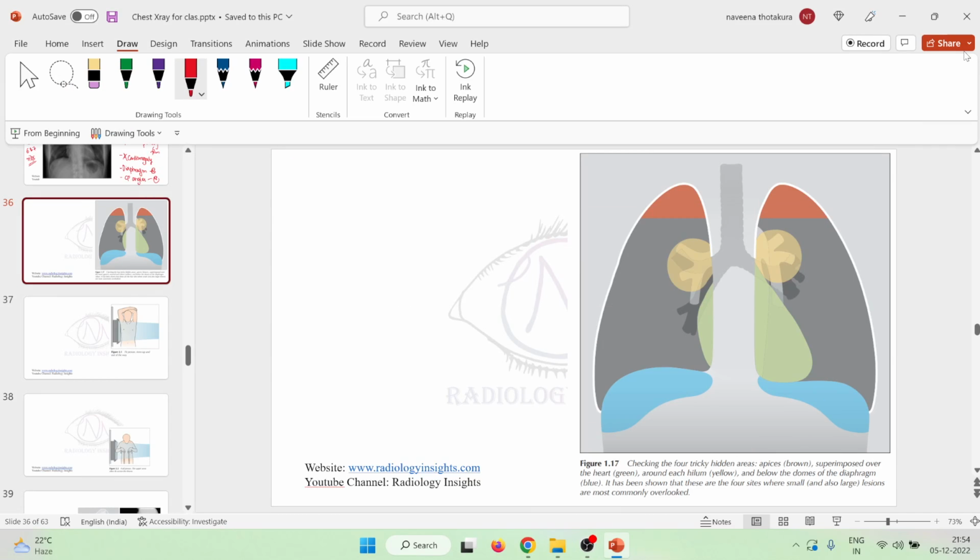Hello friends, let us now learn about lateral X-ray. Now, in the lateral chest X-ray, when do you think the lateral chest X-ray is useful? One, it is useful to check whether an equivocal frontal chest X-ray shadow is present or not.